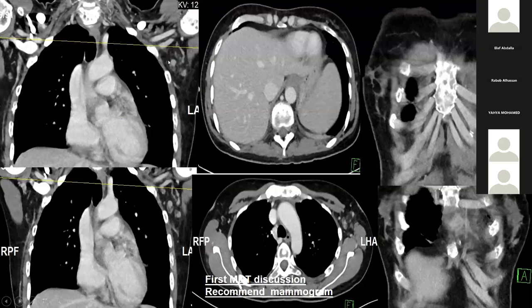Even the enhancement within the same lymph node appears non-homogeneous and nodular, and there is subtle perinodal edema. We said that there is nodular and asymmetric architectural distortion in the inferior medial breast.